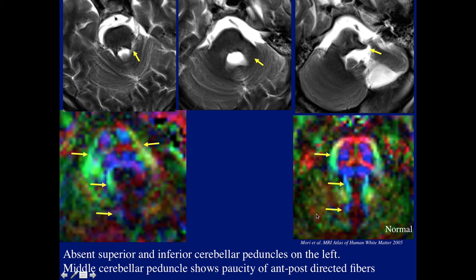So a lot of changes can be seen on these DTIs.